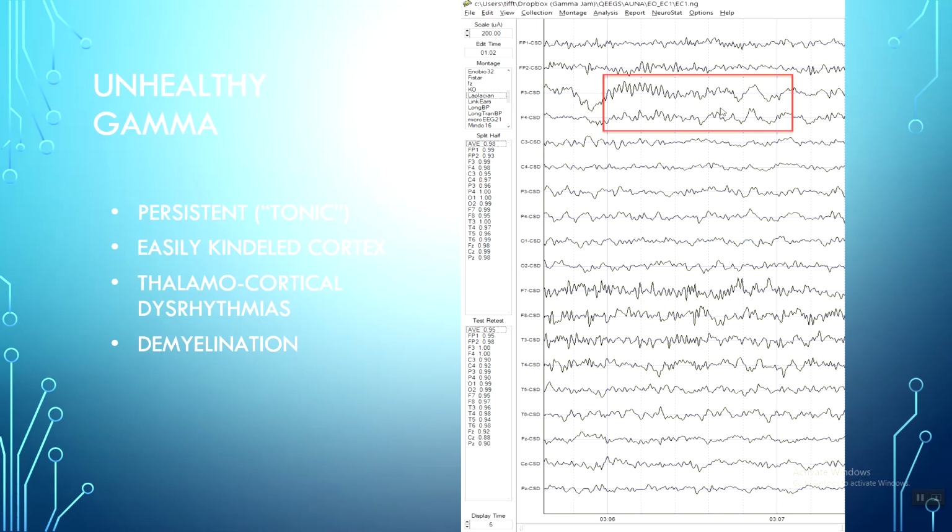But you also see it in seizure disorders, right? And so I think of it as like someone that gets so upset that they just pop, right? And so it's that building of tension that is the kindling. Or think about the beginning of a fire when you're hearing snaps and pops, right? That kindling is then kicking off a slow wave. Now in this case, nothing fantastic has happened, thank God.